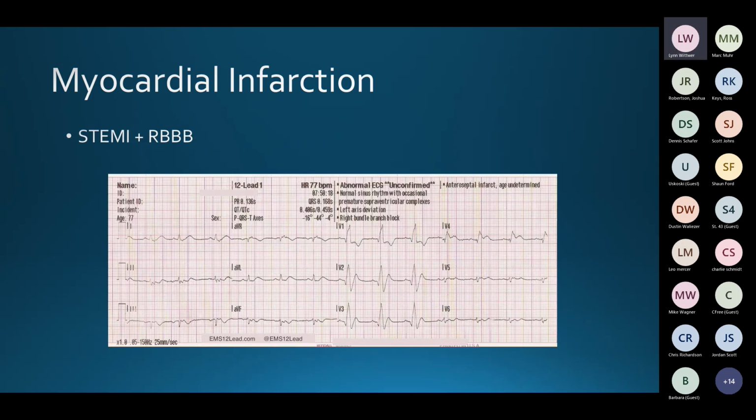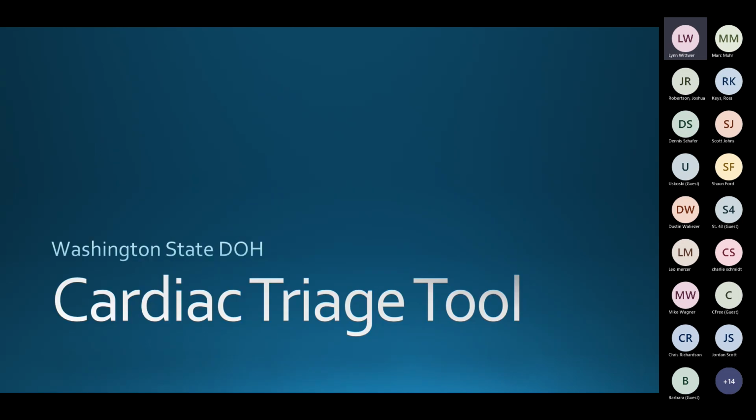Here's another one, terminal R wave. Actually, this one has a little notch in it too. And then you've got ST segment elevations in several places, and that is certainly an acute myocardial infarction.